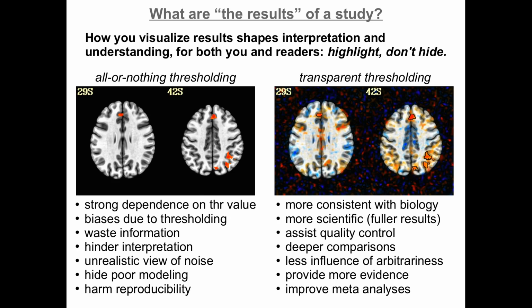It just is arbitrary. You waste a lot of information because there are results here. There are model fits that you've done everywhere. You acquired data everywhere. Why waste the information of what you found there? Because as you add more subjects or something, some of those may become significant, and it becomes much less of a change. You can actually show some of that information now.